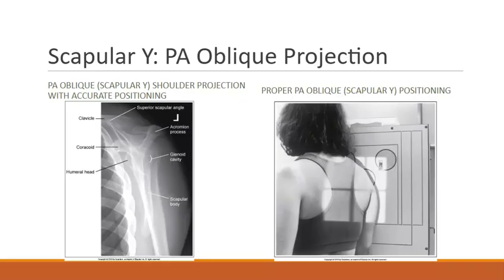When there is no injury, the glenoid cavity and humeral head, and the scapular body and the humeral shaft, are all superimposed. When there is a shoulder dislocation, the glenoid cavity does not superimpose the humeral head. When there is a proximal humerus fracture, the glenoid cavity superimposes the humeral head, but the scapular body does not superimpose the humeral shaft. The scapula should be demonstrated without longitudinal foreshortening.